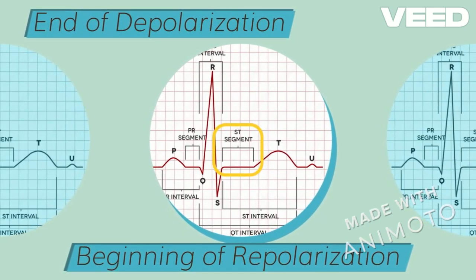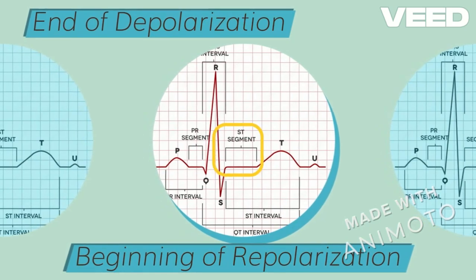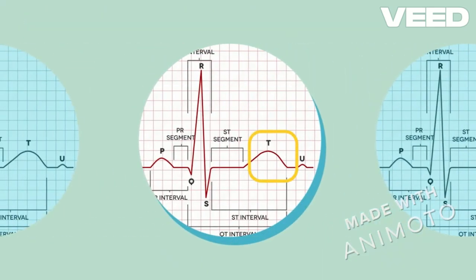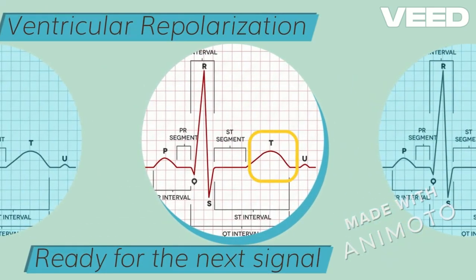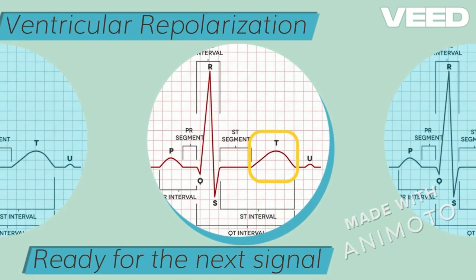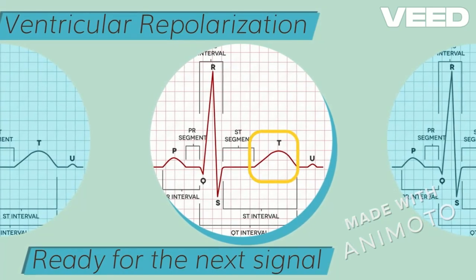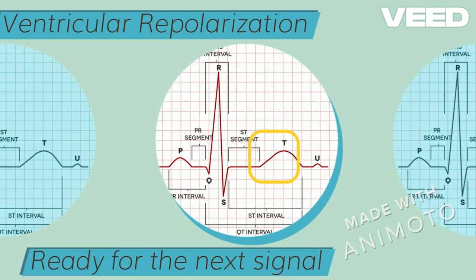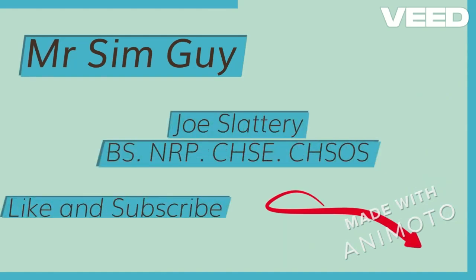We will then see this ventricular repolarization with the presence of an upward inflection called the T wave. Once the ventricles are repolarized, the EKG will return to the isoelectric line while the SA node waits for the next signal to come from the brain. Okay, so what we just saw was one electrical signal travel from the depolarization of the SA node all the way to the end of the Purkinje fibers and then the repolarization of the cells in the ventricles.